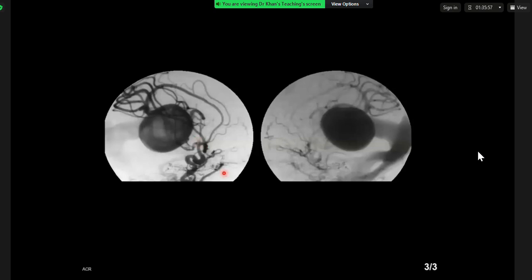So selected catheter angiogram through the posterior cerebral circulation confirms a large aneurysmal structure of the vein of Galen, which is massively dilated. This confirms the finding of vein of Galen malformation in this patient. I would refer to neurosurgery given the significant hydrocephalus that this is causing.